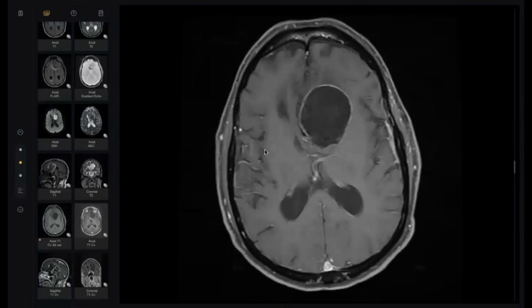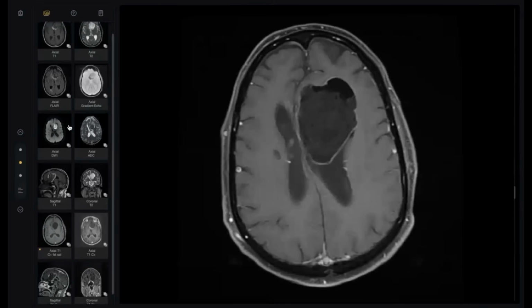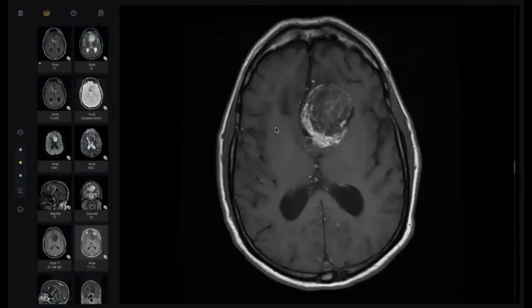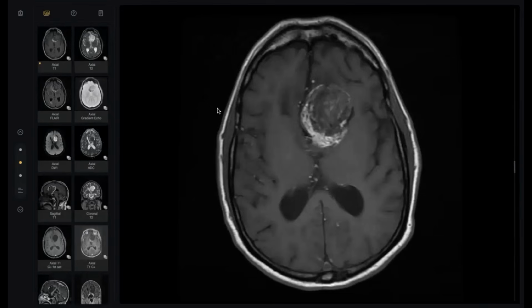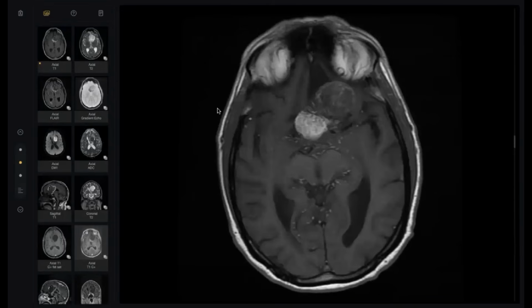This is the most important, because when you are dealing with a hemorrhagic lesion, it is a big difference and not an emergency. But if you detect this is a rupture dermoid, an action must be taken now to avoid chemical meningitis and other complications.